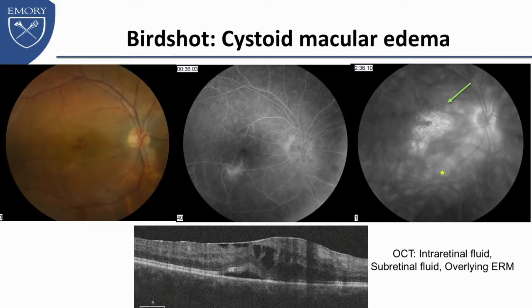Now, what we know from our individuals from Hopkins and our colleagues is that birdshot can lead to severe cystoid macular edema as one of the changes that leads to visual acuity loss. You can see that there is chronicity, and this gentleman, he was a CIA agent who developed birdshot. He also had this diffuse RPE blush from disease chronicity.